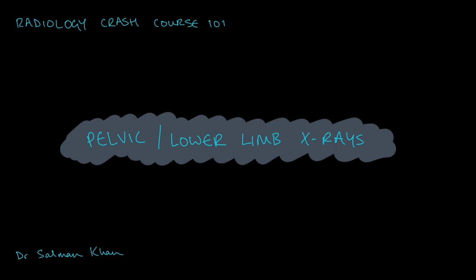I'm an SHO and I will be taking you through the pelvic and lower limb x-ray session today for the Radiology Crash Course 101. The way that I'm going to be structuring this session won't be so much to show you loads of different x-rays to show you all the different possibilities of things you might expect to see, but more to give you a framework to approach these x-rays, to give you a system that will hopefully allow you to pick out the most important features of an x-ray that you'll encounter either in your exams or on the wards in practice, on your on-call shifts and so on.